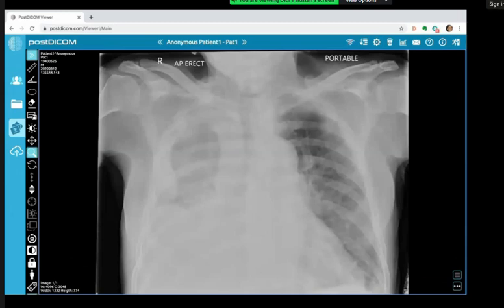So this is a frontal X-ray in an adult patient demonstrating abnormality in the right hemithorax, where there is continuous circumferential pleural thickening, loss of volume, airspace opacification, and probably a small effusion. With the diffuse involvement of the pleural thickening, I would be suspicious of an underlying pleural process, such as a mesothelioma or pleural-based metastases. With this appearance, I would move on to a CT to evaluate this further.